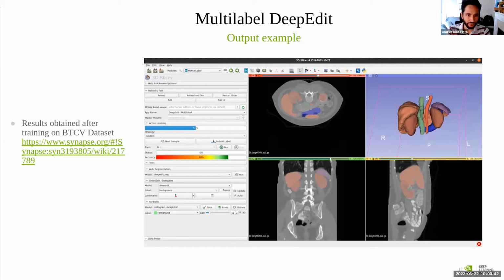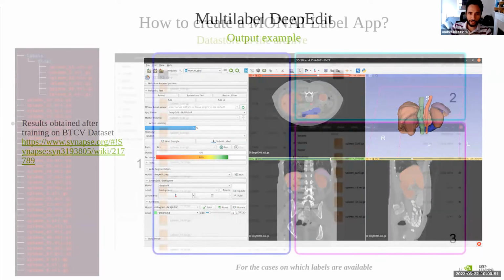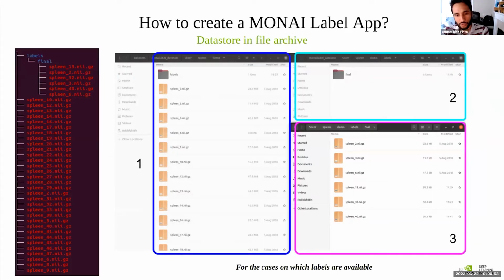So I use 8 organs to segment on the CT images, and I use as a network the UNETR, right? So how do you organize? This doesn't work for the workshop because the workshop is already sorted. So Qing already organized this very nicely. But if you want to work on your local computer, because MONAI Label is not only for the cloud, you can use it on your local computer. If you have a basic GPU, it should be enough for you to try MONAI Label.